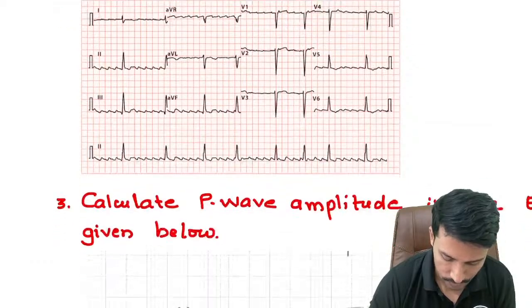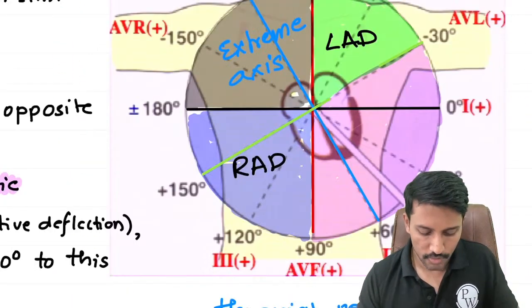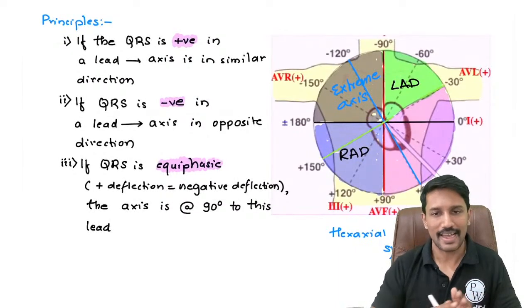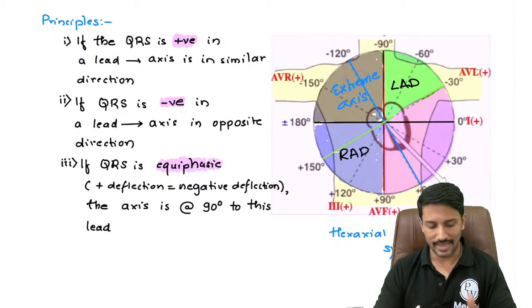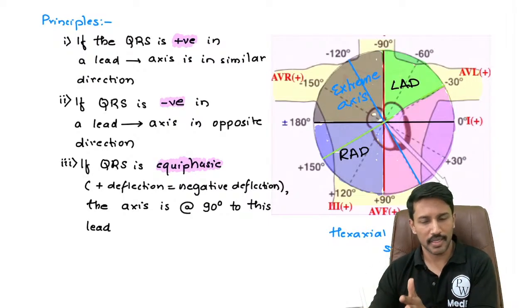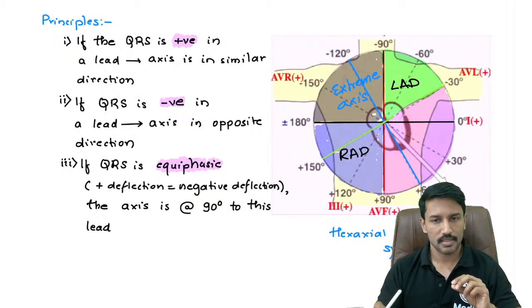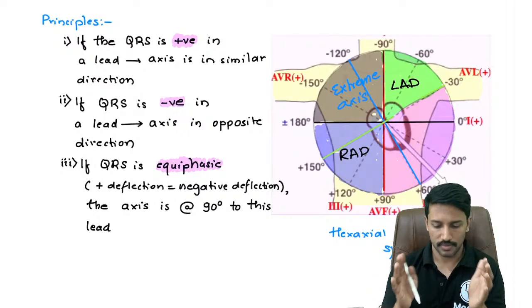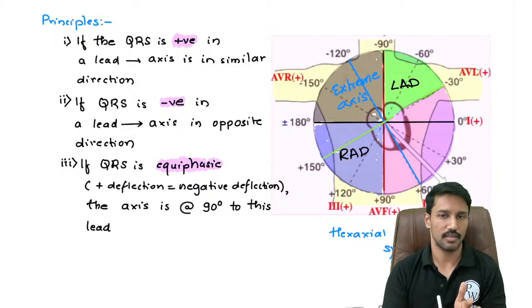Okay. This we cannot determine. Okay. So that is going to be our approach to determination of axis. I will leave 6 or 7 exercises for the determination of the axis in the PDF note. Try to determine the axis. In the next class, we will try to understand more complex ECGs where the axis determination using the isoelectric lead method does not work.